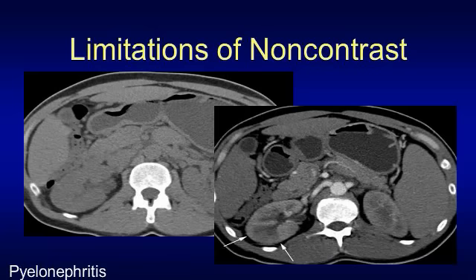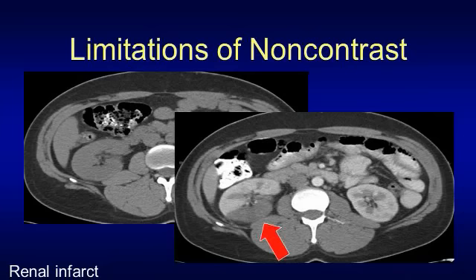On the non-contrast CT, you may see a little stranding, you may see that the kidney is enlarged, but you may see absolutely nothing, and it's only after you give contrast and you see the bands of decreased enhancement that you can make the diagnosis of pyelonephritis. Again, I want to emphasize that you do not need CT to make the diagnosis, but in some cases, patients will be having abdominal pain, and this turns out to be the cause, and it wasn't initially suspected.